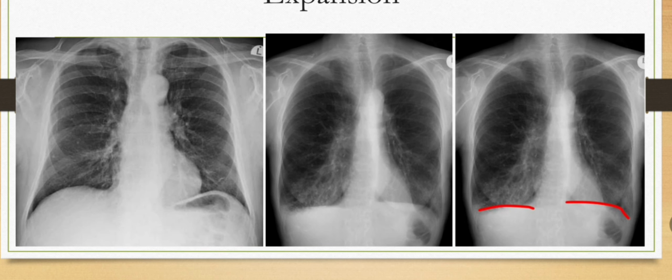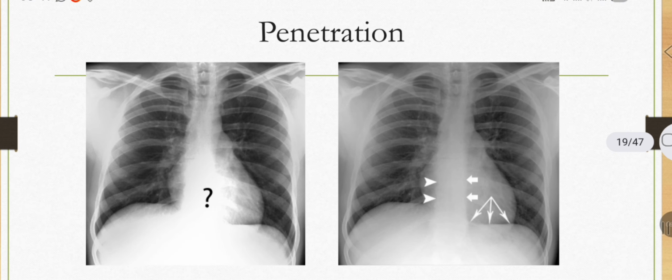Expansion. So this is an expansion X-ray. Penetration. Is there adequate penetration?